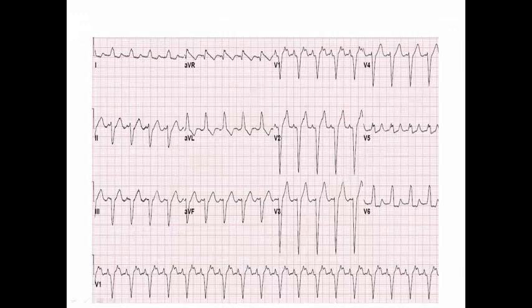Here we also have abnormal P wave morphology, as we can see in V1 that it is completely positive. We know, of course, that the P wave in V1 is usually biphasic, but here it is pointed and completely positive, suggesting an abnormal morphology that may be, for example, arising from the pulmonary vein and going forward to V1.